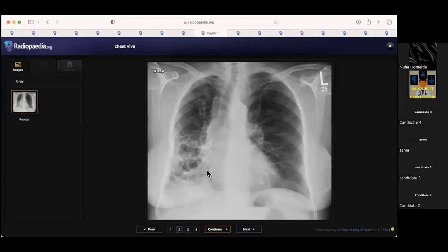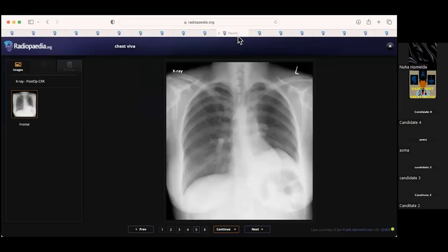This is the case of the cystic bronchiectasis. This is really one of the favorite cases. So this is a case of cystic bronchiectasis, and we've discussed how to pick up cystic bronchiectasis on X-ray and on CT, and we've given the differential for lower zone bronchiectasis.